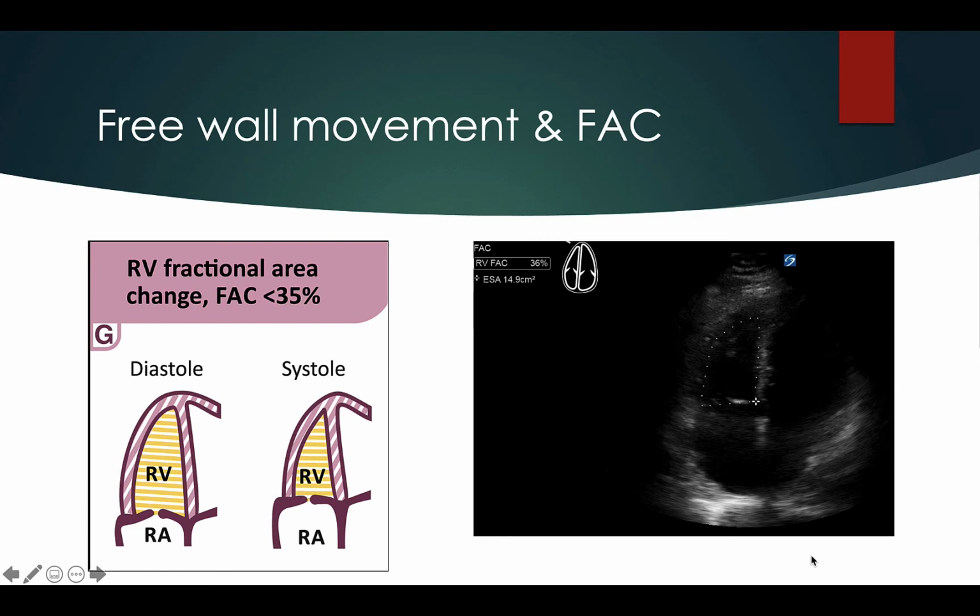Because the anatomy of the RV is dramatically different from that of the LV, you cannot use the same assumptions, namely those of a conical structure, to estimate ejection fraction. RV stroke volume quantification and ejection fraction estimation is a complex assessment and well beyond our scope today. Instead, what we look for is the change in area of the visible area of the RV between systole and diastole. Most point-of-care machines are capable of this estimate.